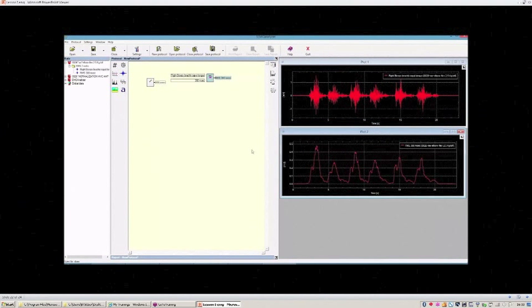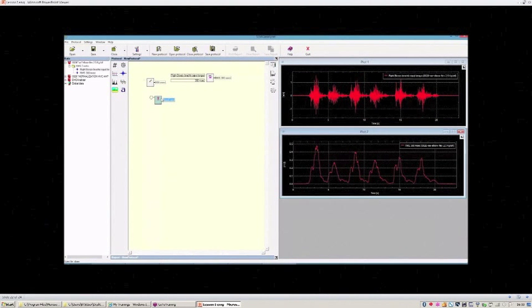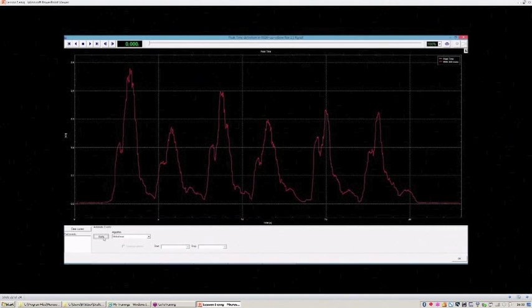So now imagine that we want to perform the amplitude normalization with respect, for example, to the peak value of the envelope of the signal. To do that, we can identify the events where we have the maximum amplitude of the signal. We can identify the events on the trace.